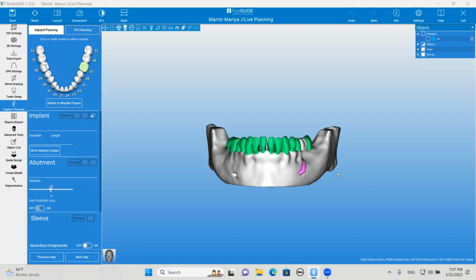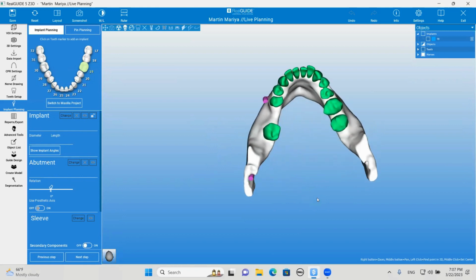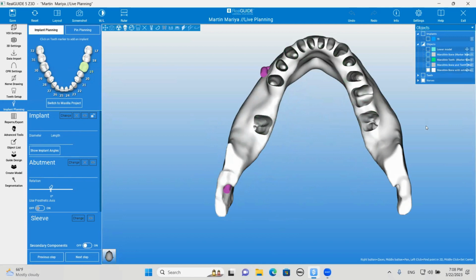Okay, great. So Hussein, let's take that tooth out that you have in there and let's do a 360. So let's look at it from the occlusal view. So right off the bat, what I like to do is, Hussein, can you remove all the teeth, please?